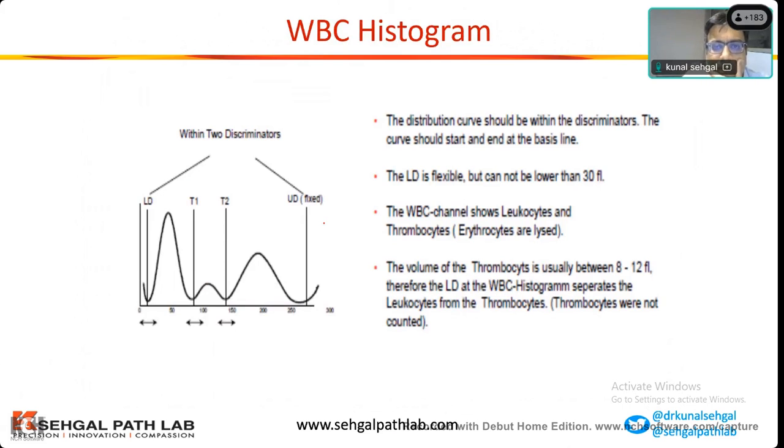So, any questions on the basics of RBC platelet histograms? Because I've just done basics. We'll go to other case studies. But any questions from any of you doctors, participants? Great. So we'll move to a WBC histogram.